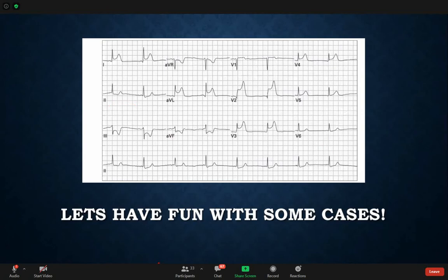After the axis, we said the intervals, right? Yes, then we look at the intervals. So intervals, let's say QTc is normal. The QRS, is it wide or normal? No, it's narrow. It's a narrow QRS. Okay, so it's less than 100. Well, PR is maybe 3 small squares. It's not clear here, it's fine. Let's assume the PR interval is normal.